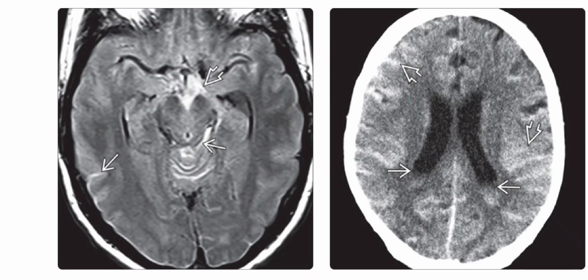Right is the axial non-enhanced CT scan in an 83-year-old man found down and shows diffuse subarachnoid hemorrhage, seen here as hyperdense fluid in virtually all the visualized sulci. CSF blood level is also present in the lateral ventricles.